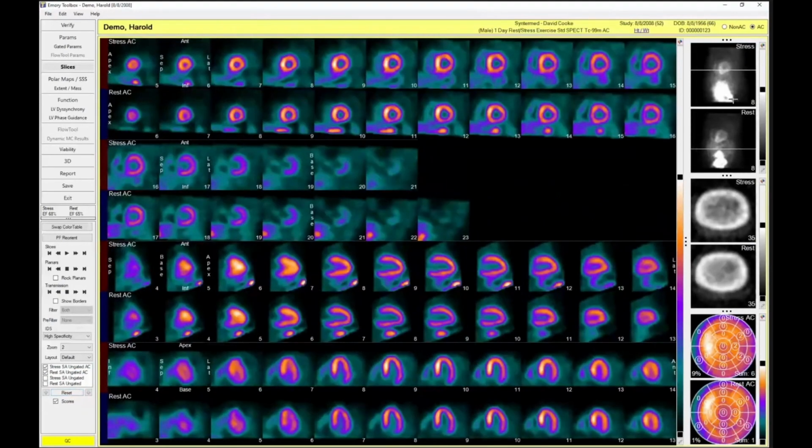We're seeing the rotating planar projections so that one could check and make sure there's no motion, but we also do automated QC of these planar projections. You'll see that down here in the bottom corner, and you'll see that it's yellow. So there's like a red, green, and a yellow. Green would be good, yellow is caution, red would be that there's a problem.